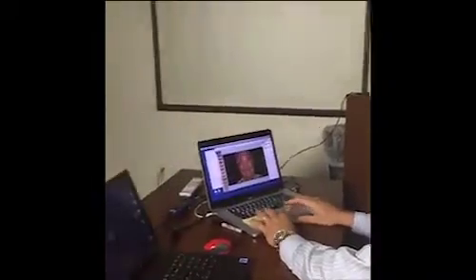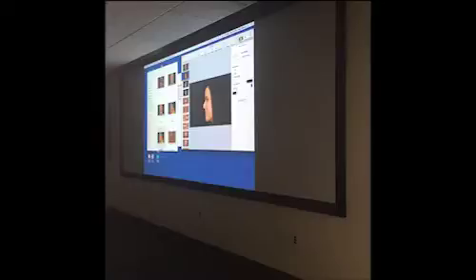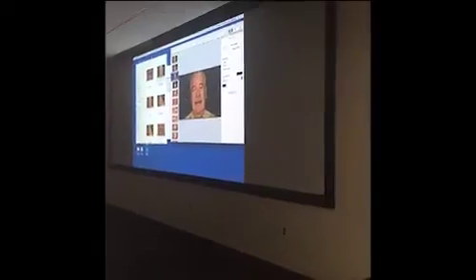If I know that I want his smile, oops, I should have gone down one, excuse me. And then actually what I could do, I could get this out of the way and make it a little more convenient because I don't need a big picture there. If I now know I want this one here, okay, and you can see how easy it is to drag these in. I would drag all of those in. As soon as I was done, I would now have all 18 of my images. I'm not going to drag every one of these in because you get the idea of what I'm doing.